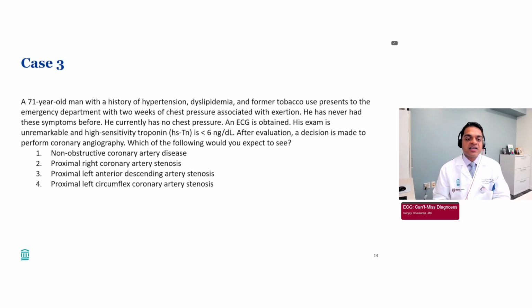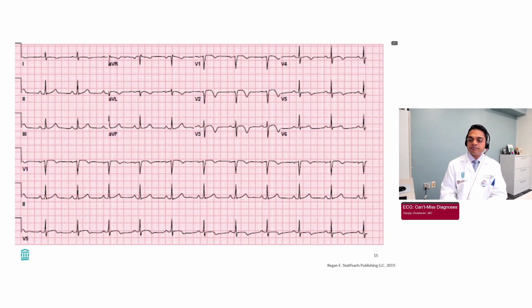1. Non-obstructive CAD. 2. Proximal RCA stenosis. 3. Proximal LAD stenosis. Or 4. Proximal left circumflex stenosis. Here's the ECG.